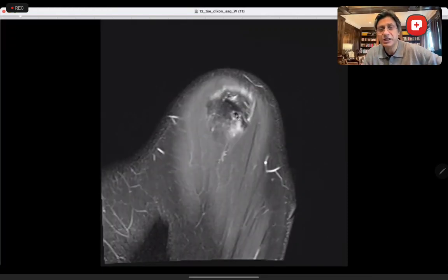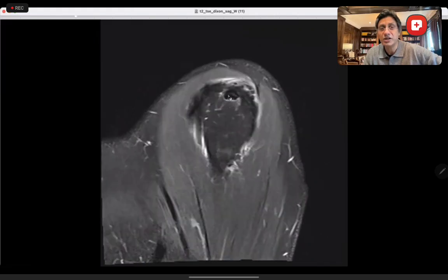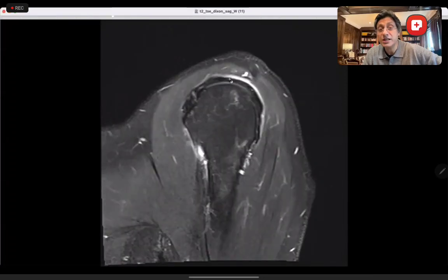So you see bursitis, you see this calcification, you see calcification. Remember, the supraspinatus tendon should have been nice and black. So you see the tendon, but there are black areas even blacker than the tendon, which is calcification. This is the bursa I was telling you about. If somebody's got bursitis, this is typically what it looks like.